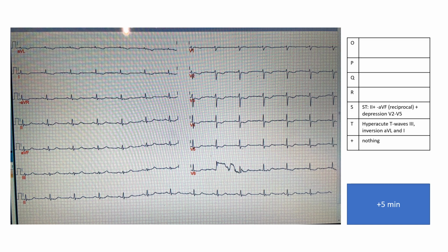We do another ECG, and now we see some changes here in the ST segment, right? So now it's V2 to V4. Now we're really worried about posterior OMI, but it's also going down to V5 and maybe even V6. We even see some maybe slightly reciprocal changes from V6.